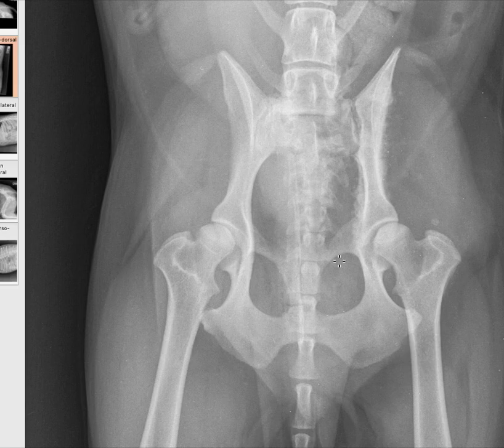The next thing I look at is zone of transition. Zone of transition refers to whether the delineation of normal and abnormal bone is sharp or difficult to define. And in this case, I would say it can be quite moderate, meaning that exactly where the pathology of the ilium ends and the appearance of the pubis is possibly more normal is quite difficult to define. The zone of transition is probably more easily assessed on long bones.